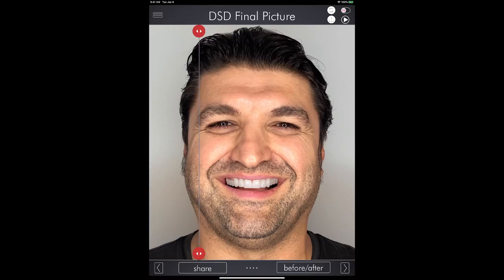When you design smiles for male patients, you have now the option to focus more on the edgy smiles. So I see designs, so that's only an observation, right? I see designs for male patients are much more diverse than for female patients.